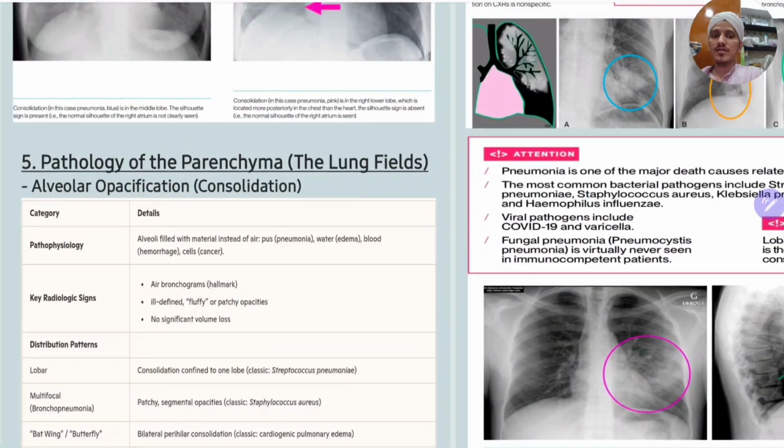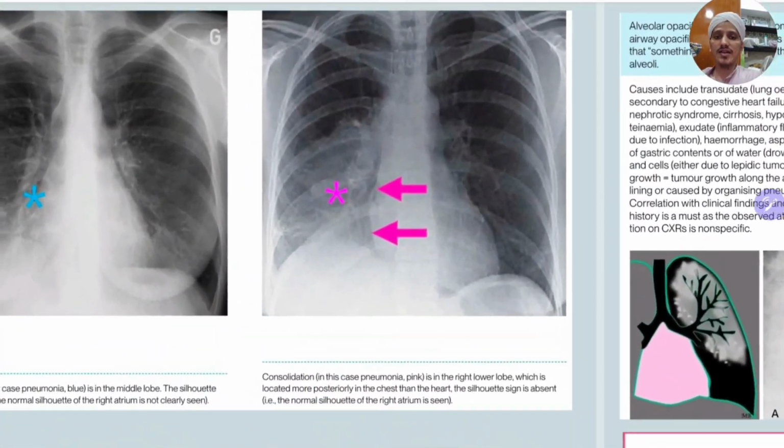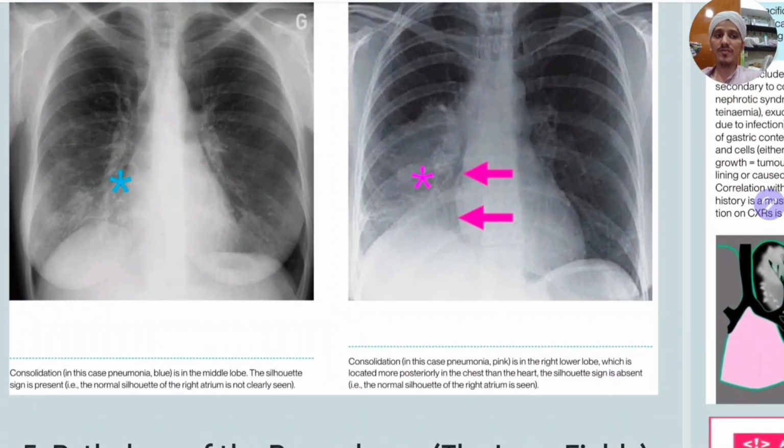Okay, so this will be the last thing, and then pathology. The next X-ray images coming will be the pathological images, and we will discuss those images. See here now. This is the shadow of the mammary glands, the breast.